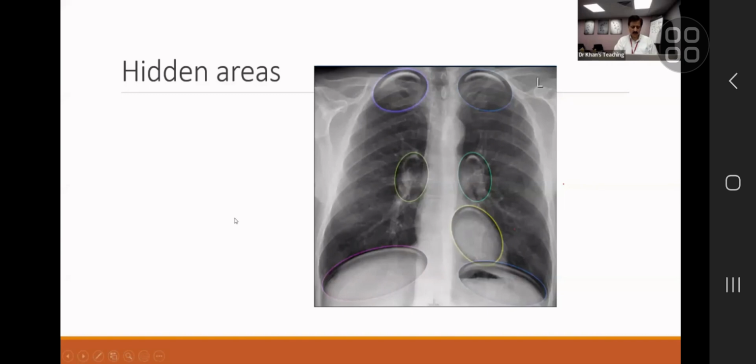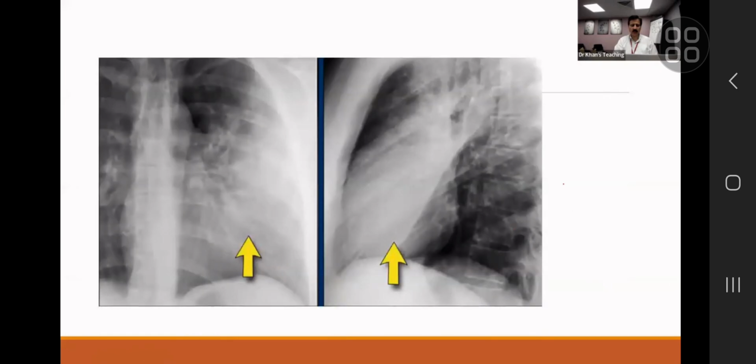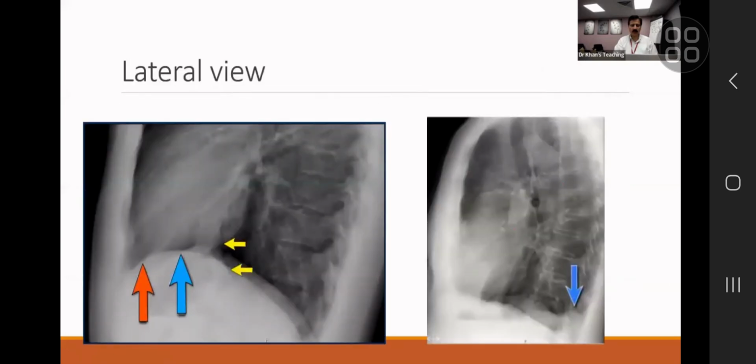Samavia, I think all the questions point to one thing. If you can go to a lateral view of your choice and just highlight the landmarks of anatomy, and there are questions about how to place something, if it is in left lower lobe, right lower lobe, where is the right diaphragm versus the left diaphragm. So over to you. Just point out the normal anatomy.